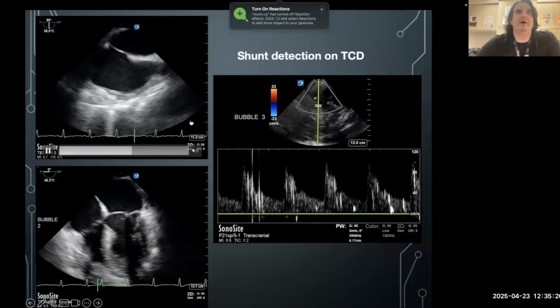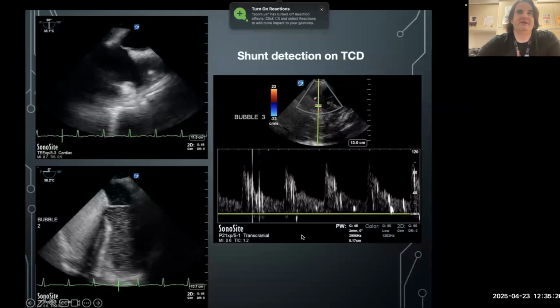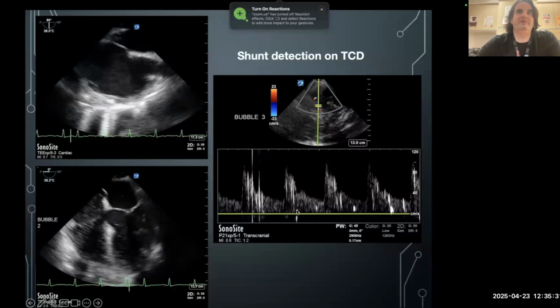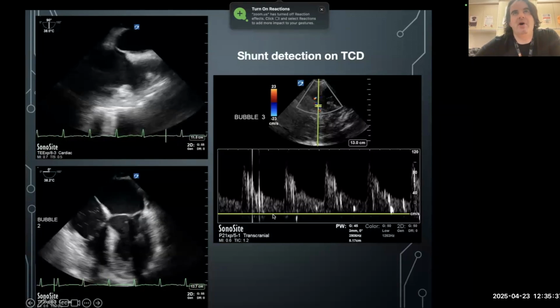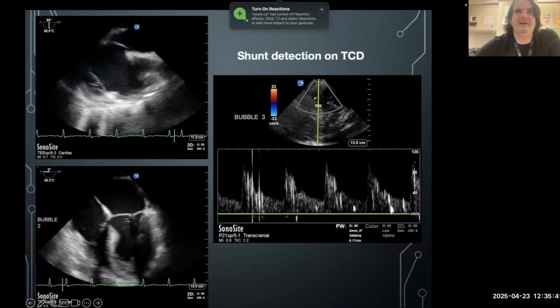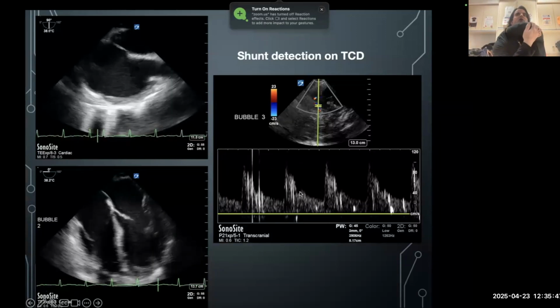And here's just an example where we discovered, so transcranial Doppler can be used for this as well, for PFO detection. In fact, some studies suggest an even higher sensitivity of TCDs for PFO. That's with a special stereotactic rig, however, that does continuous emboli monitoring. But this is what it's showing here, is that you have your arterial waveforms, and it's actually being interrupted by these high frequency spikes.